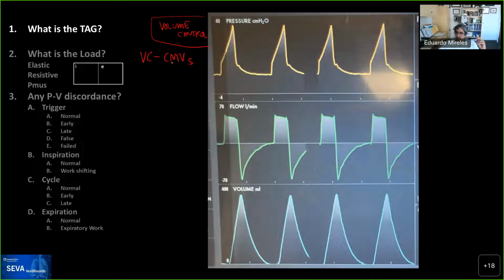Again, this ventilator shows a little bit of irregularity in the waveform, and that is related to the way that it's programmed to display the flow waveform, but in reality it's a square waveform. One thing you learn when you learn to read waveforms is that you're going to see a lot of little disturbances, and you have to see through them. But essentially, this is a constant flow, so this is volume control appropriately.